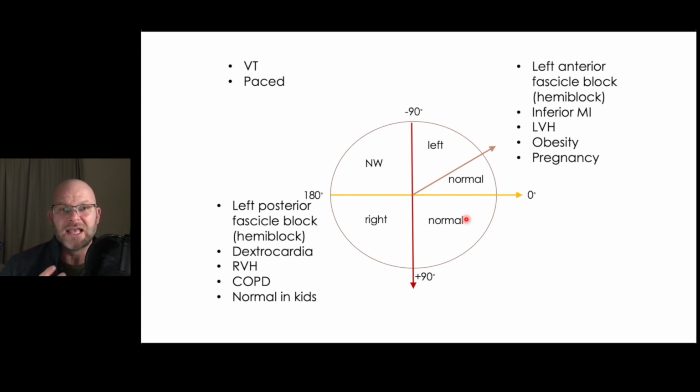As someone who has COPD, that right ventricle gets stronger trying to push through that diseased lung, and that right ventricle grows in thickness. So some of the energy may aim toward that. So some of these things can actually help us corroborate their other comorbidities. But you look at pregnancy. Certain times normal phases of life can cause the deviation to be there, as you see in pregnancy here, or even in kids on the right axis deviation.